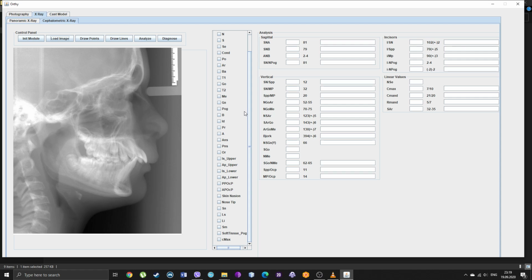As you will see later, there are some points that are not used in the analysis, and they are here because I will upgrade this program someday when I have more time. Currently I'm out of time. Time is the enemy.